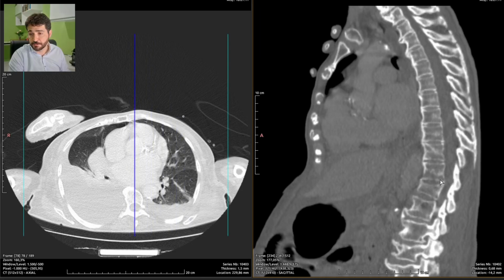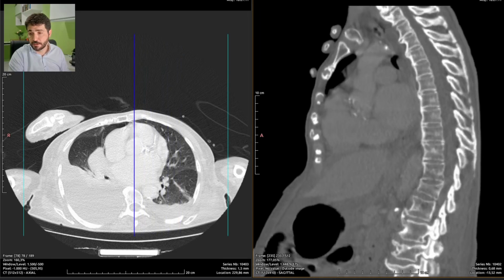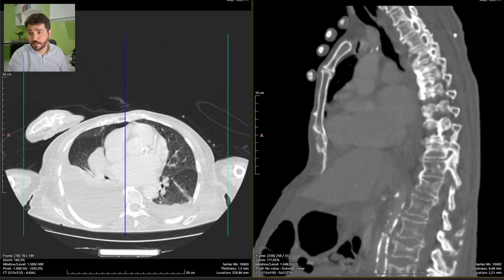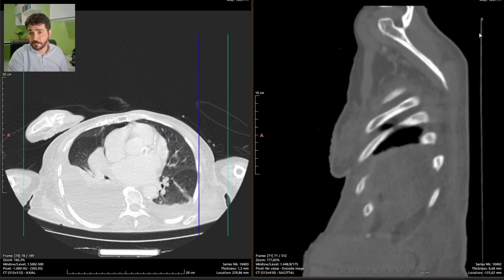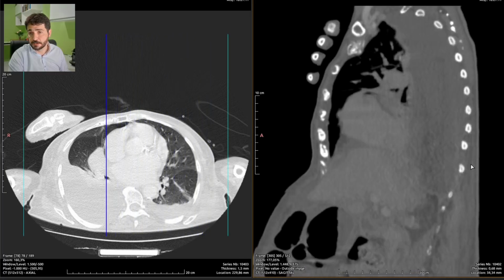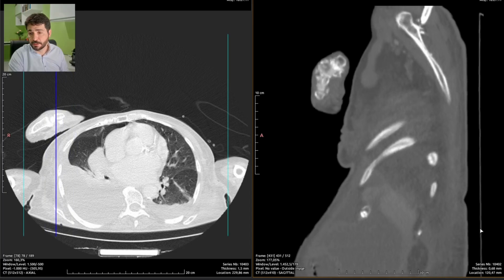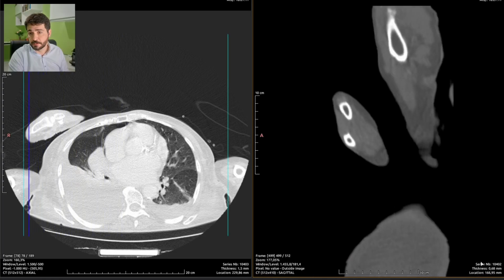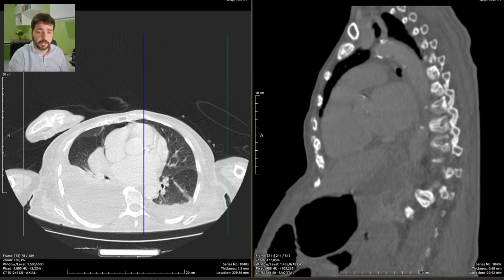So there is a chronic fracture and a partial collapse of the 12th vertebral body and diffuse spondyloarthrosis of the dorsal spine, which is quite common at this age. So this is just an old patient being that old. So her hand is fine. She has done her nails.